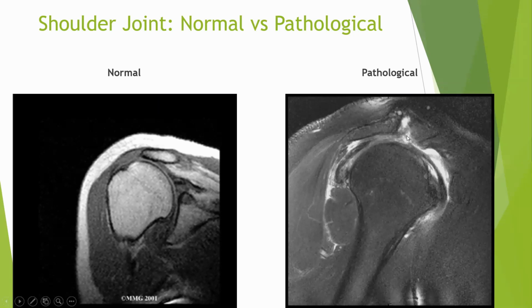Again, am I looking for a fracture or other bony anomaly? No, I am only looking for soft tissue issues: tendon, muscles, ligaments or cartilage issues. Wherever there are soft tissues, it could be contractile or non-contractile. Those are the structures I am looking at. So, a rotator cuff tear.